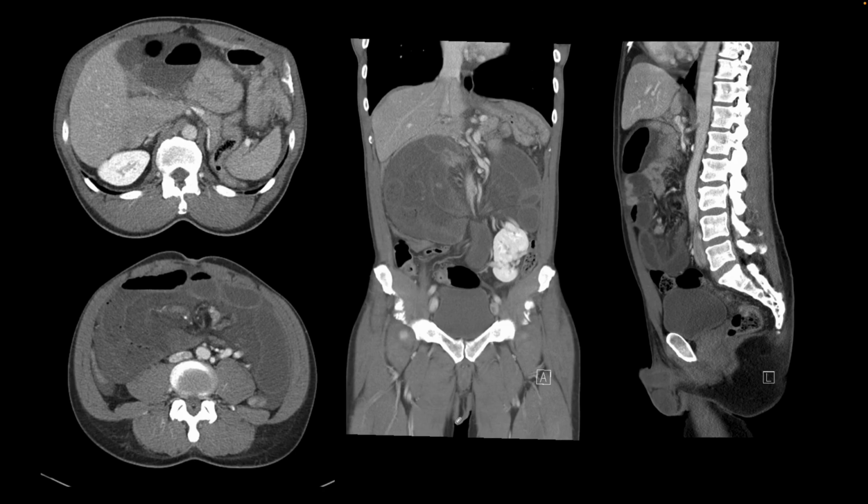This next patient presented with sudden onset of abdominal pain, nausea, and vomiting. We performed a CT of the abdomen and pelvis, and here we see the classic whirlpool sign of dilated and distended small bowel loops. You can see right here, they're in the pattern of a whirlpool around this part in the center where we have the SMA and the SMV. The relationship between SMA and SMV has been reversed, so the SMV is seen on the left, SMA is seen on the right. Also, the swirling of the mesentery is seen right there.